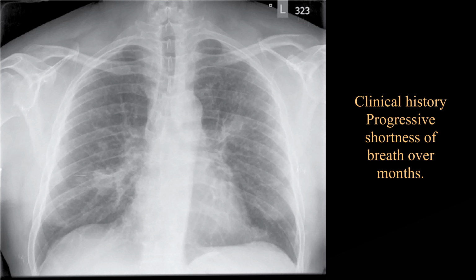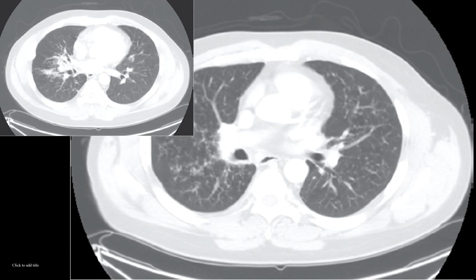Student doctor. Can you explain findings on this CT study? The two lung window images from the CT scan show multiple small perilymphatic, subpleural and parabronchovascular nodules. Areas of beading and irregular thickening can be seen along the bronchovascular bundles. No enlarged lymph nodes are seen on these selected images. The findings are consistent with sarcoidosis.